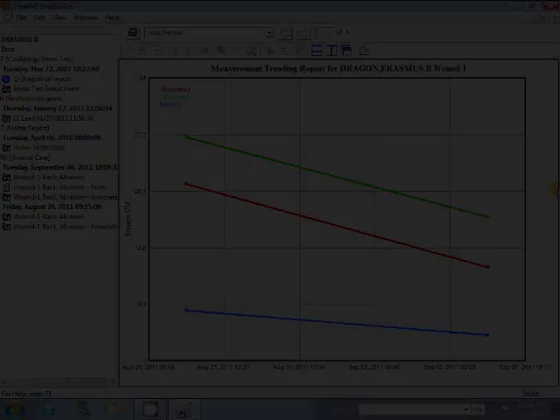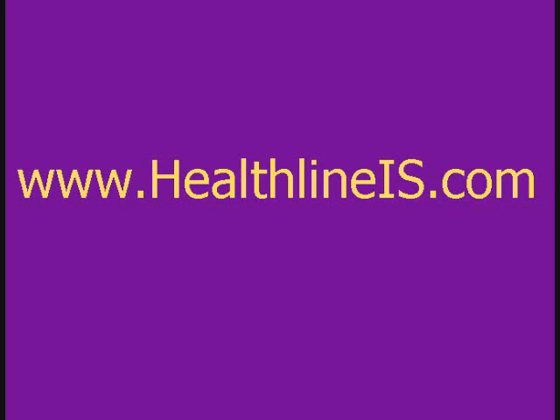That's a quick tour of HealthEPix. Remember that it's not just for wound care. If you've got pictures you need to organize and have viewable from your hospital or practice management system, this application can help.